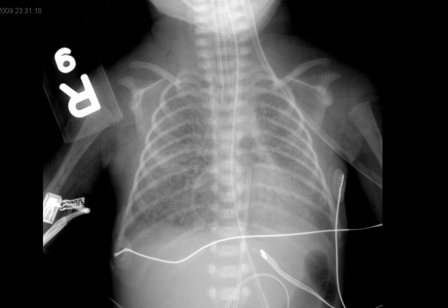As I alluded to, this is probably the most serious and usually fatal complication of interstitial air. If you'll notice, this baby has fairly mild interstitial air, pretty much confined to the right lower lobe, but he's got a large amount of air in the right atrium. There's air in the main pulmonary artery. This air, I think, is probably refluxing into the right jugular vein. That's too big to be the carotid artery. And usually these infants die shortly after the radiograph is taken.